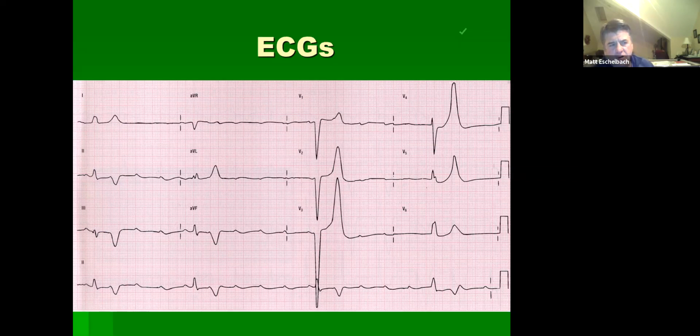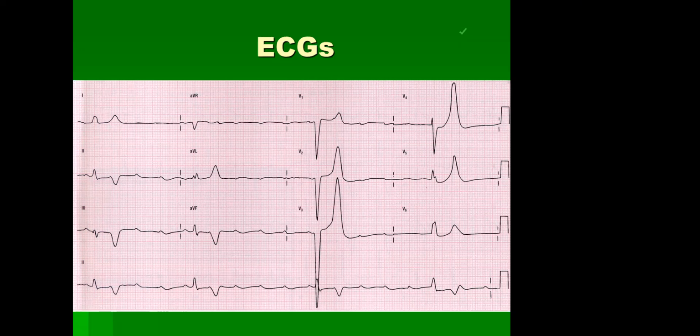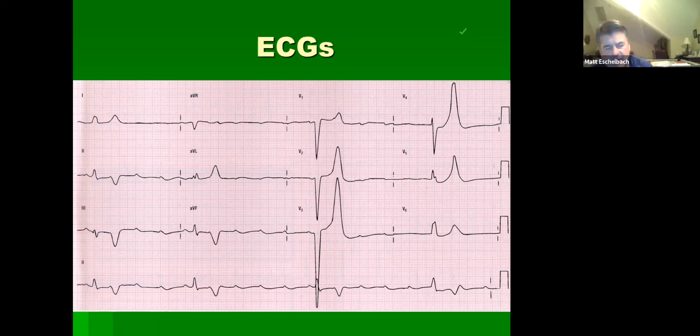The ventricle, if it doesn't receive a signal from the sinoatrial node, is going to fire intrinsically at a rate of about 30 to 40. So here we have a rate somewhere between 30 and 40. We got a whole bunch of missed beats.